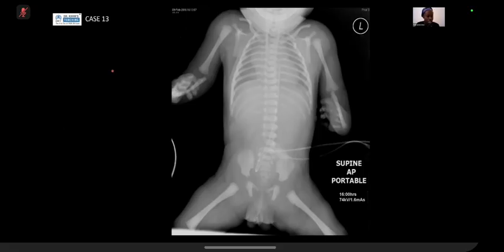The umbilical arterial catheter should be seen in the aorta. There are two positions: high level and low level. High level should be above D10. Lower level should be just below the L3 vertebral level, to be away from the renal arteries origin.